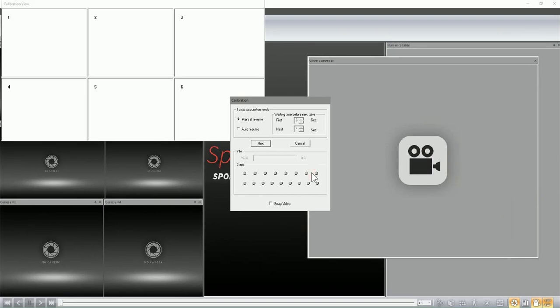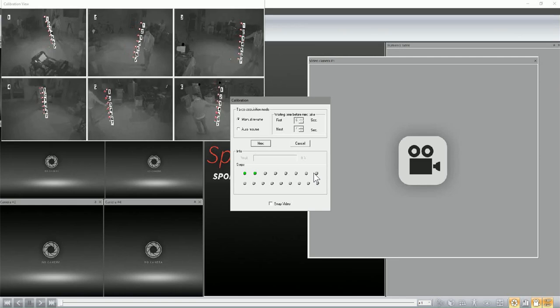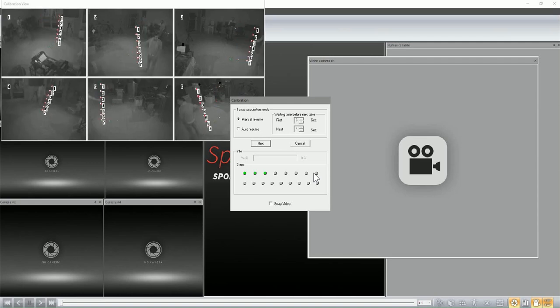He will be moving and tilting the rod to different locations. That's the first one. Second one. That's the third one. He's making sure to tilt the rod for each of the takes, the fourth one, just to ensure some proper calibration in the horizontal axis.